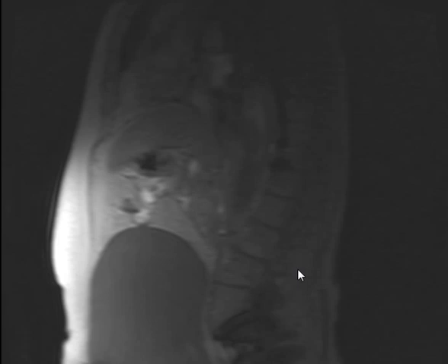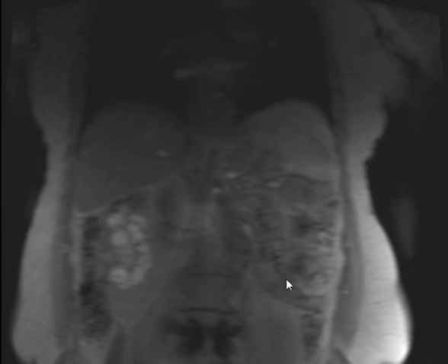74-year-old female patient presented with abdominal distension, abnormal ultrasound, so MRI was recommended. Abdominal distension for how many days? Long duration abdominal distension. First of all, what is this sequence? This one is coronal. This is a localizer, not used for diagnostic purposes. Okay, we'll start easy. This is called localizer. That's just for localization, not for diagnosis.